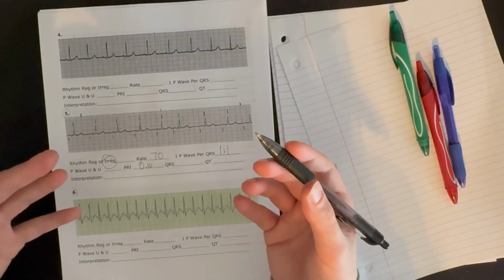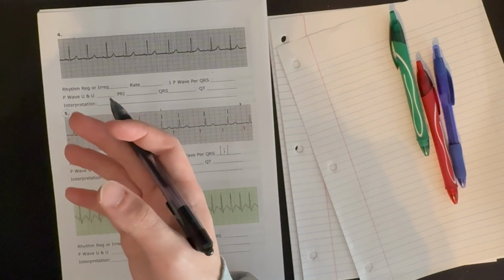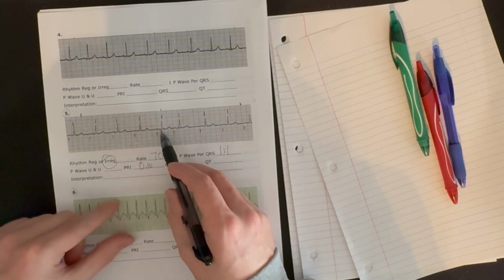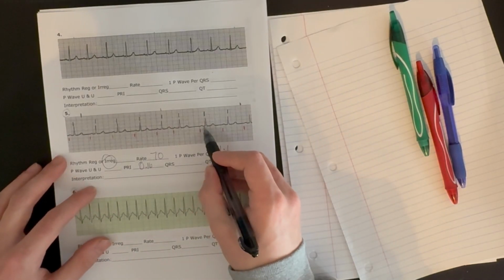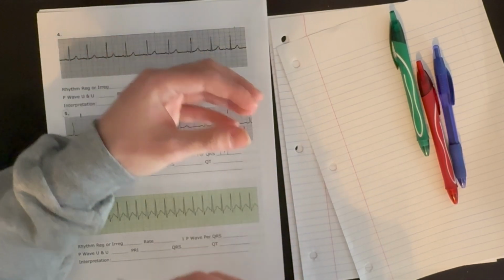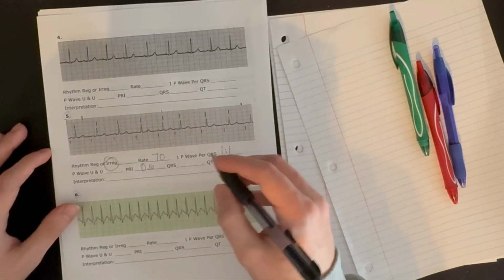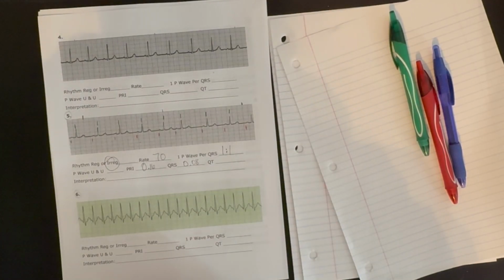So that tells us what? That our signal is originating from above the ventricles and taking the normal conductive pathway. We know that there's a P wave before each QRS complex, so the atria are getting depolarized, and our P wave is how it normally should look. So this signal is starting in the SA node, coming through the atria, going to the AV node, taking the conductive pathway down into the ventricles and depolarizing them. So 0.08 seconds.